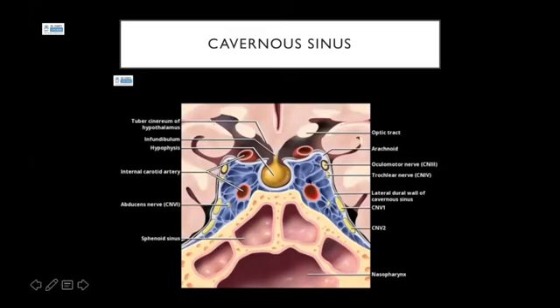So the cavernous sinus, just in the region of the pituitary here, I'm going to mention the cavernous sinus. Unlike other dural venous sinuses, it is divided by a number of fibrous septa into a series of small caves, which is where its name is derived from. So the normal lateral wall, which is here and here, should be either straight or concave, i.e. inward sloping. If this wall is bulging out, it suggests there's pathology in this region.